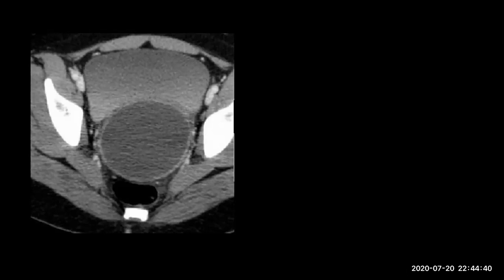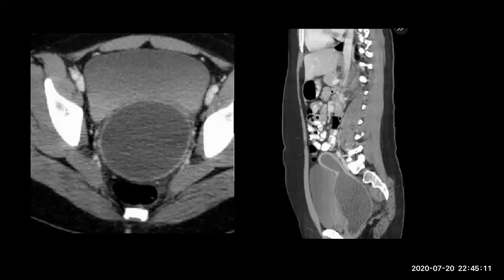Only one question allowed. About the menses of the patient. Okay. And what is the next step? Do you want any image to confirm your diagnosis? Ultrasound pelvis. Sagittal of the CT. Ultrasound, sagittal, okay, or CT, or ultrasound, or MRI. This is the sagittal CT scan, and you see hematocolpos.